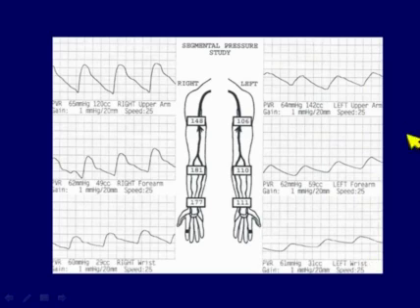So what we can safely assume is that the problem is at the beginning, that there is probably something up here in the subclavian leading down, so that when we take a look in the upper arm, we already see a change, and that change is probably the result of a subclavian artery stenosis. We can see that in these waveforms, and we can also see it in the Doppler pressure measurements, in that we have greater than a 40 millimeter of mercury difference left to right.